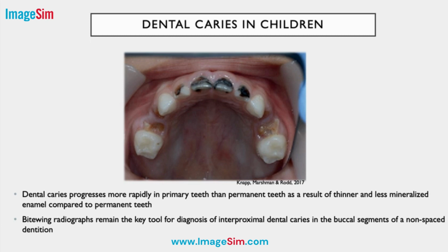Bite-wing radiographs remain the key tool for diagnosis of interproximal dental caries in the buccal segments of a non-spaced dentition.